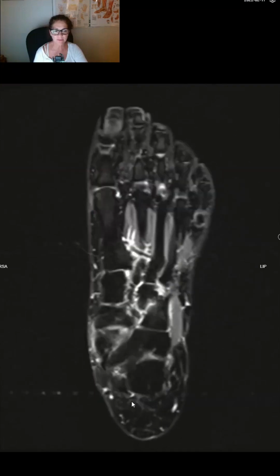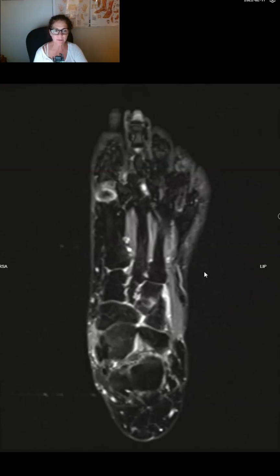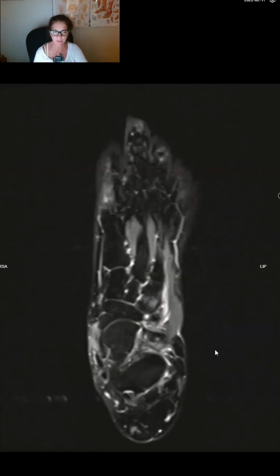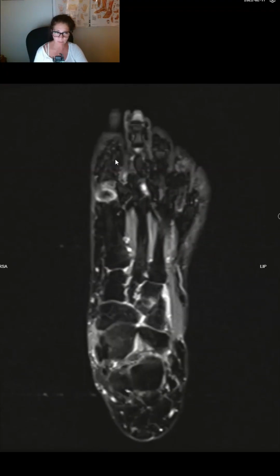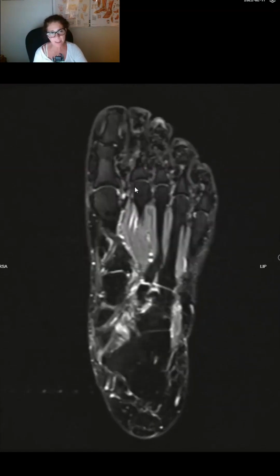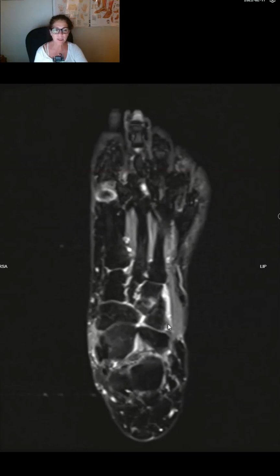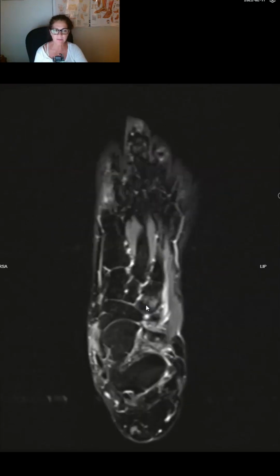And I would suggest that if you're doing foot and ankle imaging, you want to include the hindfoot to the level of the midfoot for any ankle protocol or hindfoot protocol. And then the forefoot would include the midfoot. So you can start at the middle of the cuneiforms and look out to the forefoot. And if it's a specific issue with the plantar plates, you may want to do a toe protocol in addition for diabetic foot.